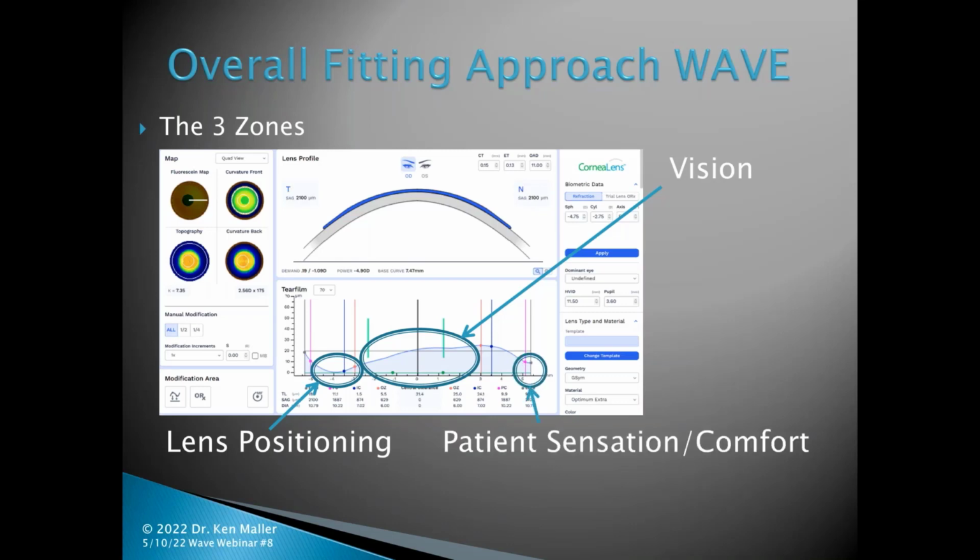And then this very outside area between the pink and black ball, that's all about what the patient is going to feel. So if you take a look at those first two ovals, regardless of what you do there in terms of creating alignment, that has nothing to do with what the patient is complaining about if they're telling you it's uncomfortable. The place that they're talking about is out here, unless there's something grossly wrong with those central areas.